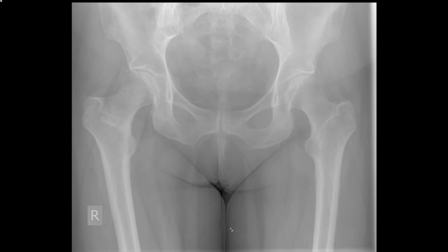And yet another patient with a clinical history of a fractured neck of right femur. There is a fracture here, and it is more subtle. I'll give you a few seconds to look at it to see if you can spot the fracture.